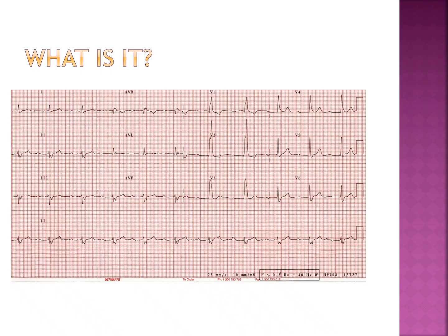Okay, so AVR we looked at first. It looks normal. Lead 1, it is going upward, so our left index finger is pointed up. In AVF, I know what you're saying. Well, some of it goes up and some of it goes down. Well, where's most of the velocity going? The majority of the velocity or the terminal forces are going downward.